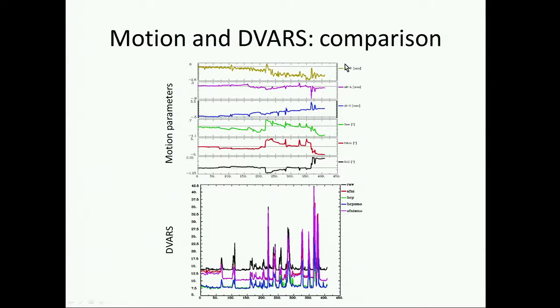You can compute the first derivative of the fMRI signal time series and take their RMS average, and you can do that based on whatever data treatment you use, let's say raw or after preprocessing. The raw here is the black trace. It shows you that when you have moments of head motion, that generates a transient large-scale variation in your data set. So it's a big signal change occurring all throughout the brain corresponding to a point of motion.